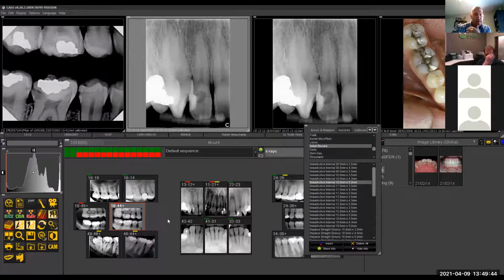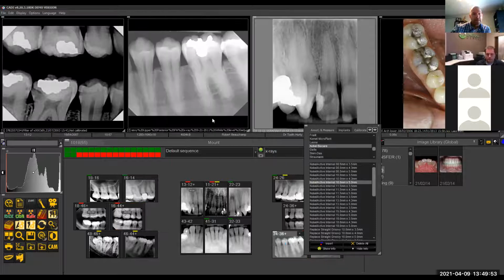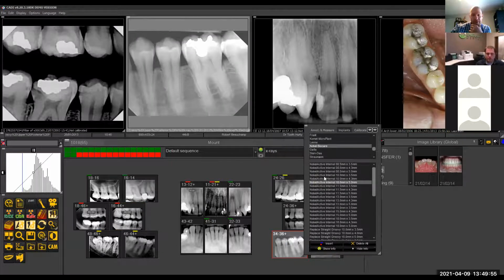Unfortunately, my demos are all a whole bunch of images that I've had over the last 25 years that I've imported and used and kind of mixed. So some of them are original images and some of them are not, and some of them are calibrated and some of them are not. So I just got to find one. Can you find one? I'd like to see what that looked like.